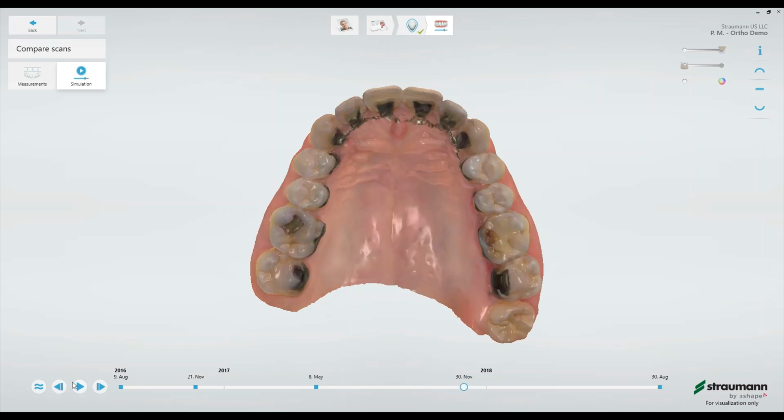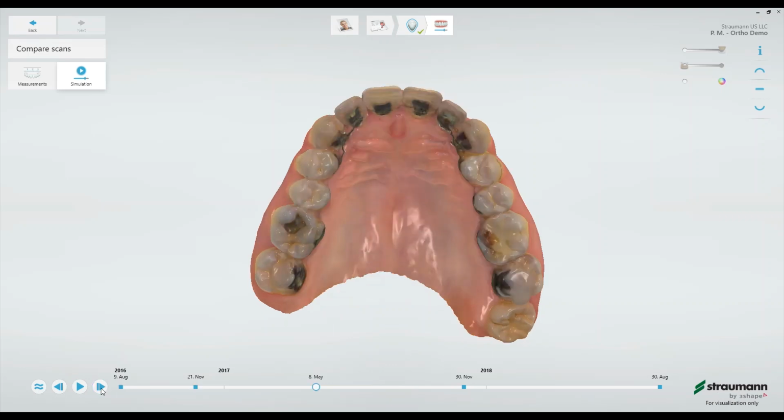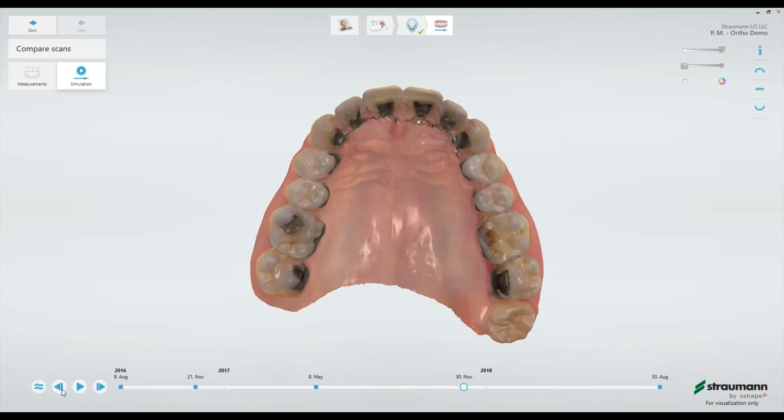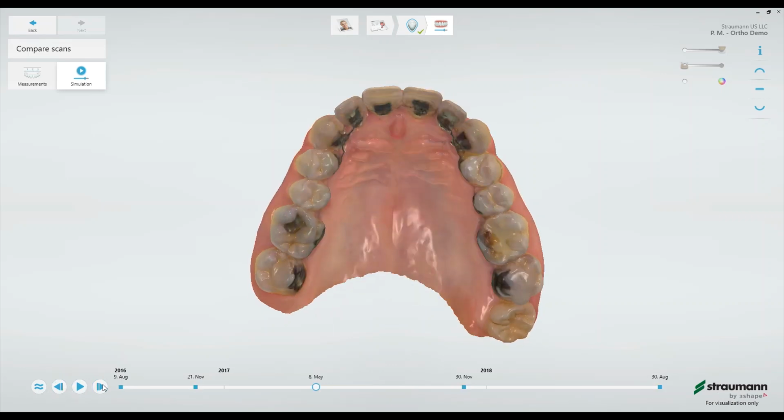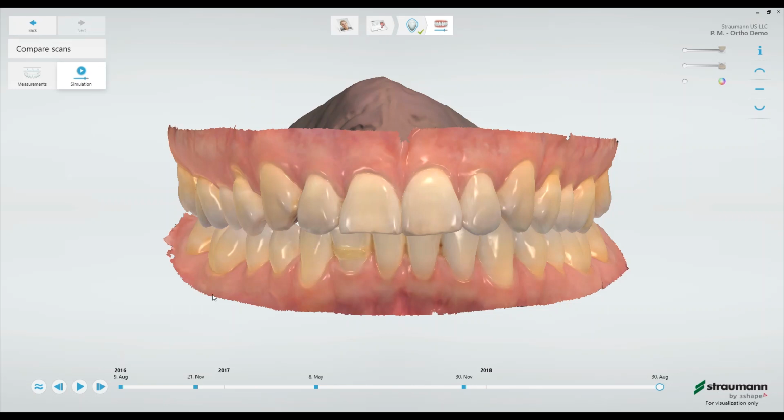And then this button, the next and forward buttons here, will progress through the individual timelines, or timestamps I should say, one by one. So once again, this was the patient monitoring app.